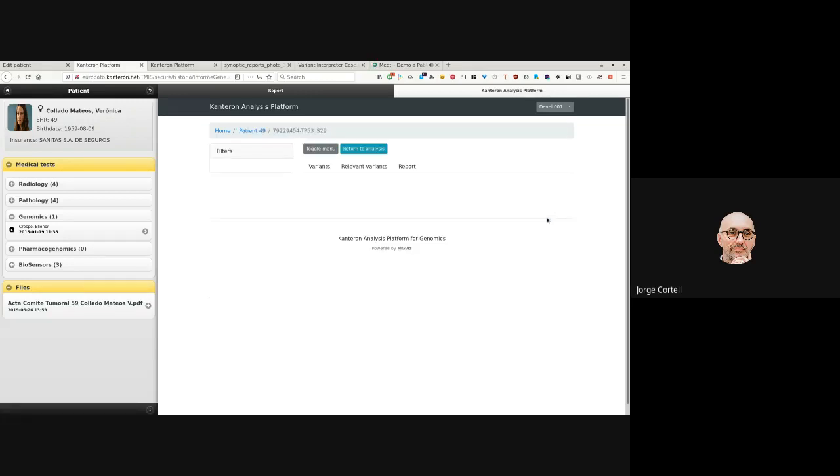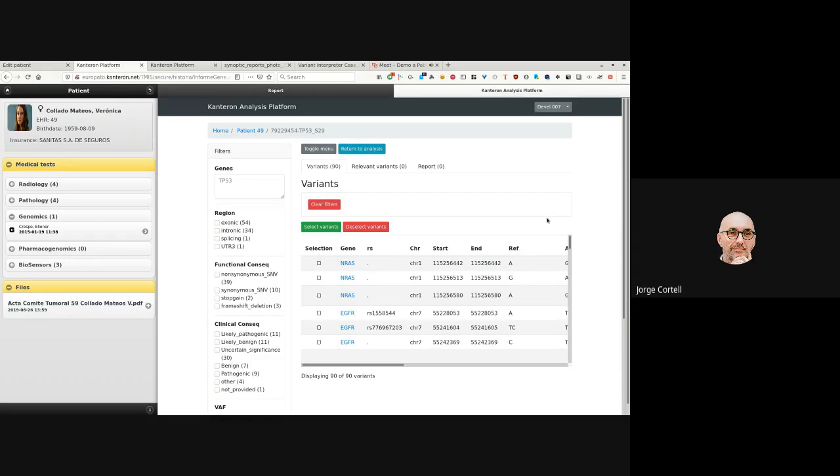What you actually visualize, you visualize filters. And like I said, this is after the big platform. The big platform is going to crunch through all the genomic data. It's going to go through all those filters. It's going to do all that processing. This is what comes after.